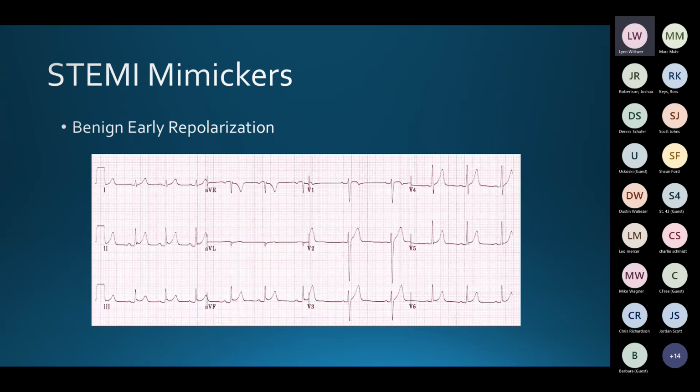So contextually, you would say, well, this probably isn't a cardiac event. So here you see this little notching in here, a little notching in here as well. Don't see it as well as you would expect in those leads. But you see some that looks like it's ST segment elevation in the inferior leads.